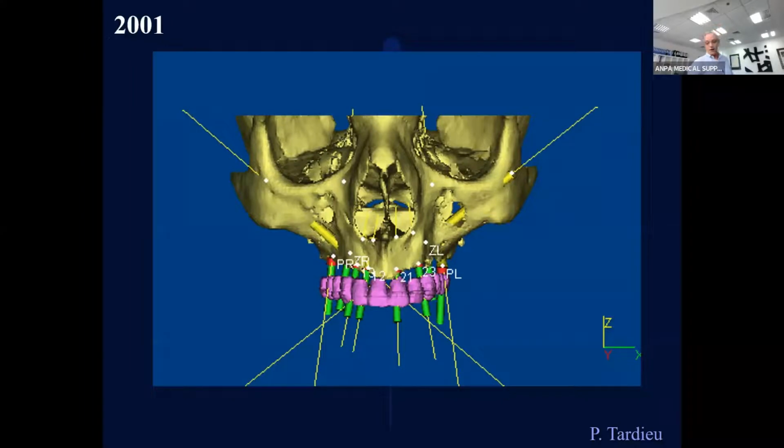I have been doing a case where you have 4 anterior implants, 2 Zygoma implants, and 2 implants on the pterygoid wings. I am going to explain how to draw a Zygoma implant, how to draw an implant in the pterygoid wings, and also how to plan implants in the anterior. So you will know how to do this kind of case, and it is very interesting because due to all these implants, we can immediately load, and the patient is very happy to have his implant so fast. I'm not talking about a new way to make an immediately loaded bridge.